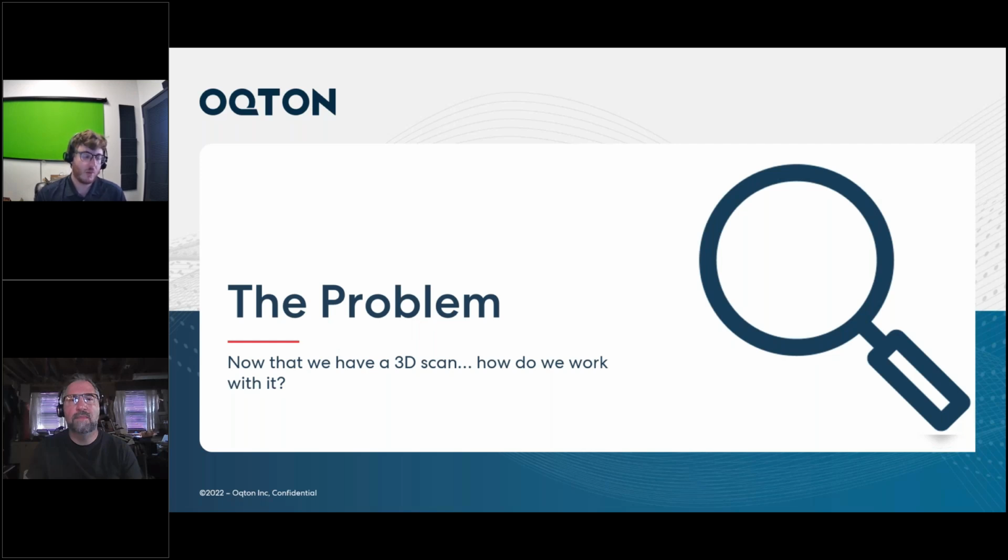So, at this point, we've now gotten our mesh file. We've created essentially that mold. We've gotten the representation of the patient. But now we run into a commonly found issue: okay, we have the mold, but how do we actually create the thing to design, how do we design around this? How do we actually create the casting or the medical device that we need around this patient?